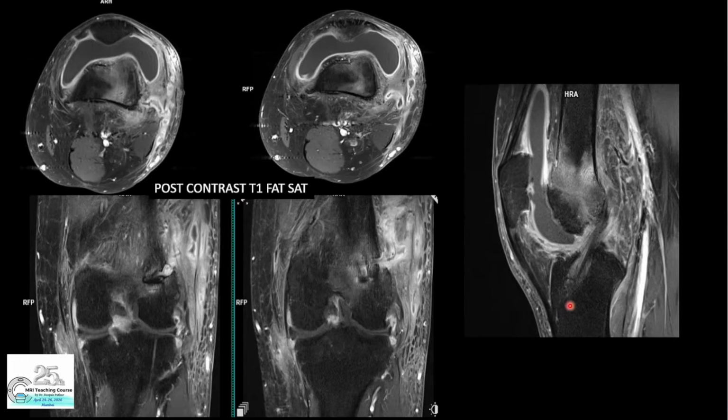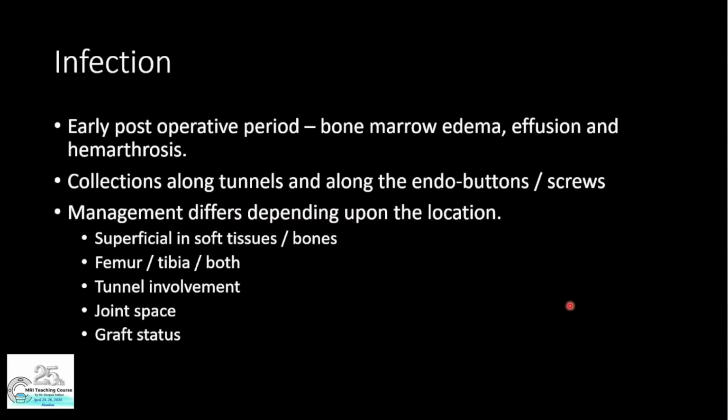So obviously this patient had to be put on high-grade antibiotics, the graft had to be taken out, and a resurgery was done. So when it comes to infection, one has to be a little bit careful while calling something as infection.